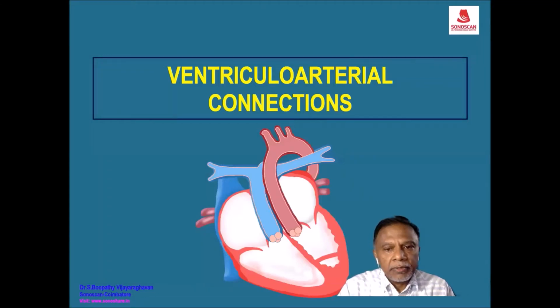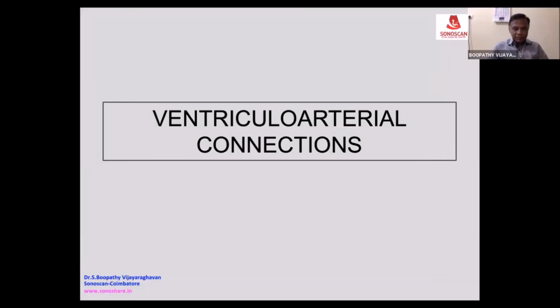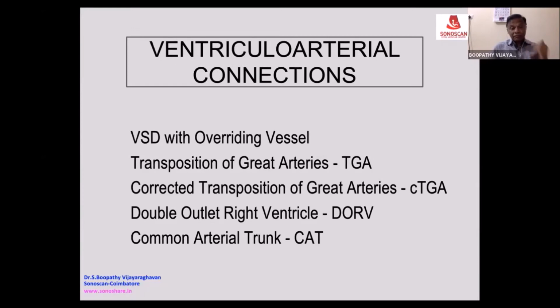This is a preview of the lecture video on fetal echo, the ventriculoarterial connections. The various headings covered will be shown as short snippets which will follow. Today's topic is ventriculoarterial connections, LVOT.